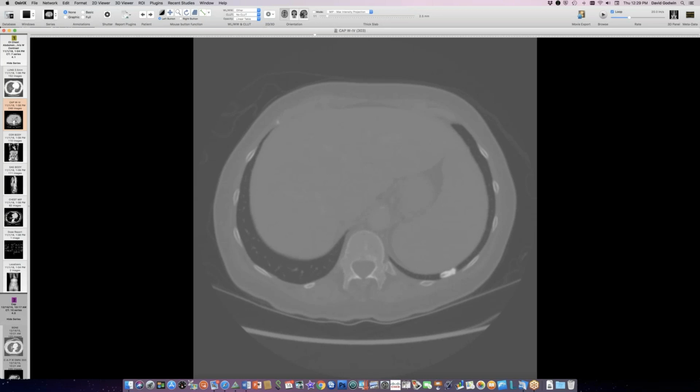and I was told by one of the residents this morning that on abdominal imaging, the epiploic fat things that can calcify often have a rim calcification. So she wasn't discounting that one of the considerations for these thoracoliths is fat necrosis, like the anterior fat near the heart that presents with symptoms suggesting a myocardial infarction or pericarditis, which is actually infarcted epiploic fat. She said that in the abdomen, that can have a rim calcification. So she thinks that this rim calcification doesn't exclude this coming from fat.